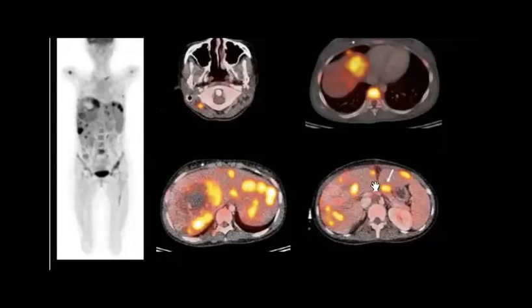When you see this odd metastasis, and you also see the aggressiveness of this tumor, giving lesions everywhere in the bones and so on, with the age of this patient, you will put a differential. You agree with me? Also lymph nodes. Yes, you will put a differential of leukemia, lymphoma, and so on.